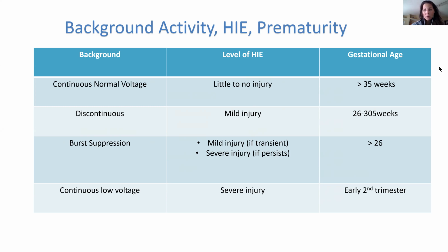We know what is normal for a term baby when it comes to aEEG patterns, but what we want to do is to talk about, based on the injury, what are we seeing and how does aEEG support us in getting us there.